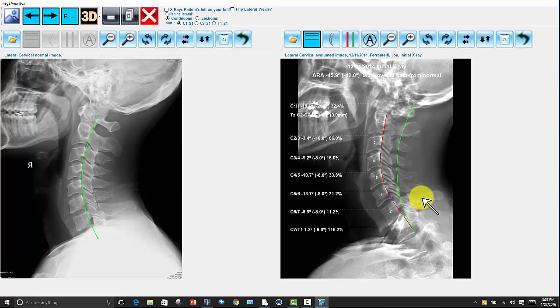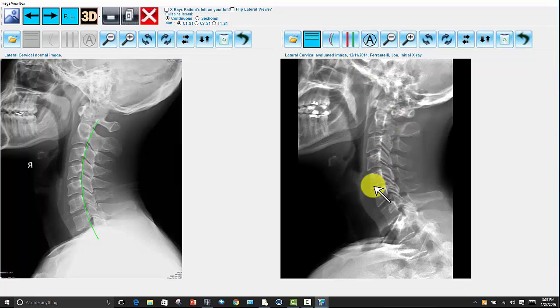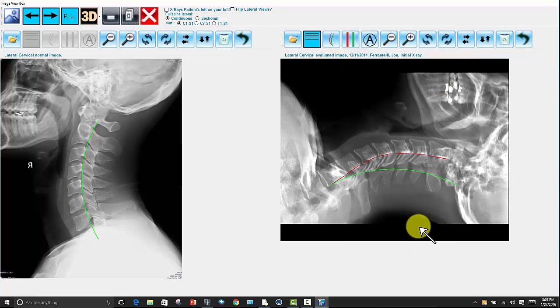Anyway, with that said, if you want to turn the x-rays on their side and things like that, for instance, if someone's asking you, well, doc, what's that drop table do? Well, I could turn it on the back here. And, you know, Mrs. Jones, when we drop the table down when you're laying on your back, the headpiece is dropping this way, and we're bringing your spine to a more healthy, stable position towards that green line is what we're doing.